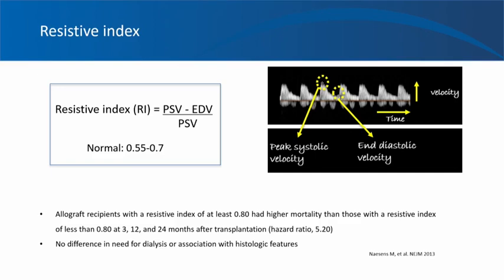The utility of resistive indices is controversial because of their non-specific nature, but they do help when interpreted along with pertinent clinical and laboratory data. Too low values may warn you about a possible problem with vascular anastomosis. Too high values may suggest rejection and prompt early biopsy. But note that they can be high essentially in any intrarenal cause of AKI, such as acute tubular necrosis.